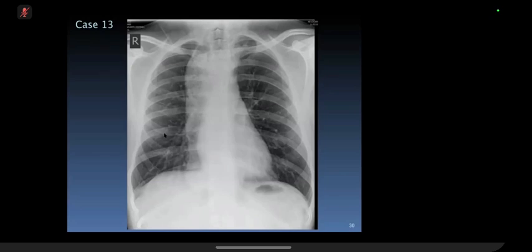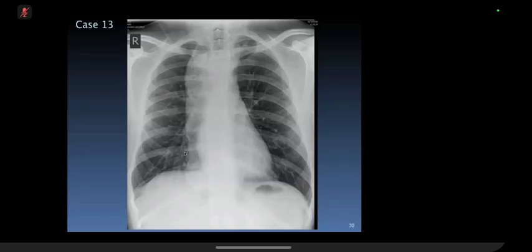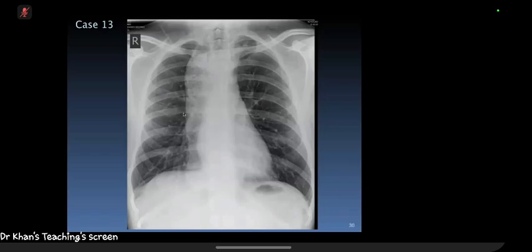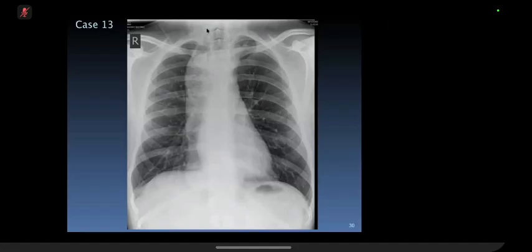So the mediastinum has got an increased density more on the right side throughout the whole right chest, and there appears to be some debris or material within this structure. So I think this is a dilated... I mean, initially I thought this would be a dilated esophagus. Then what made you think against that? Is there anything that made you think otherwise?